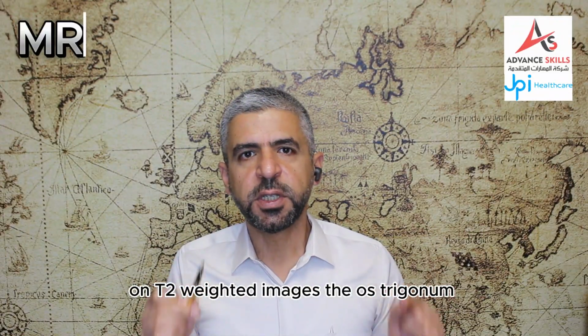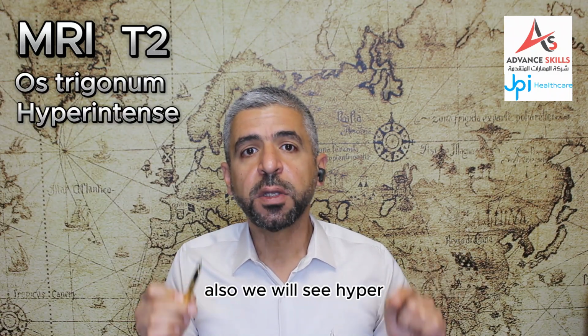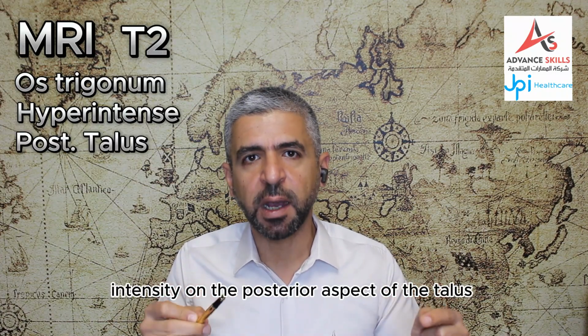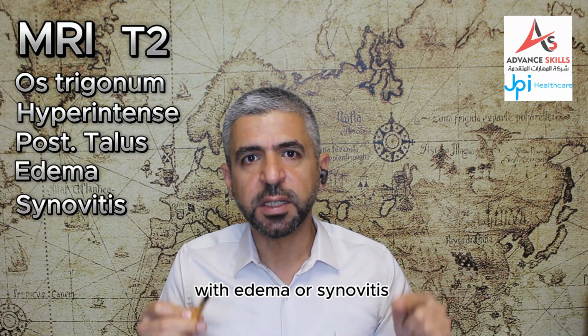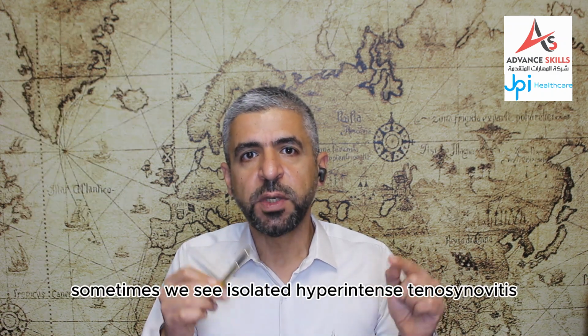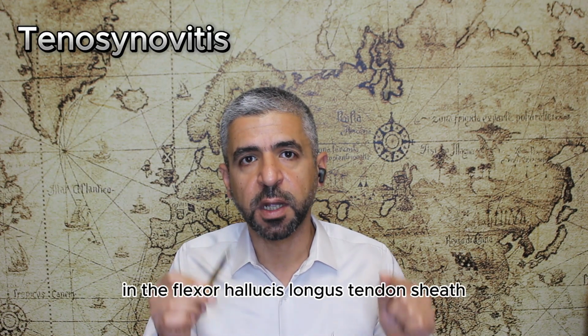On T2 weighted images, the os trigonum or the trigonal process will appear hyperintense. Also, we will see hyperintensity on the posterior aspect of the talus with edema or synovitis posterior to the talus and superior to the os trigonum. Sometimes we see isolated hyperintense tenosynovitis in the flexor hallucis longus tendon sheath.